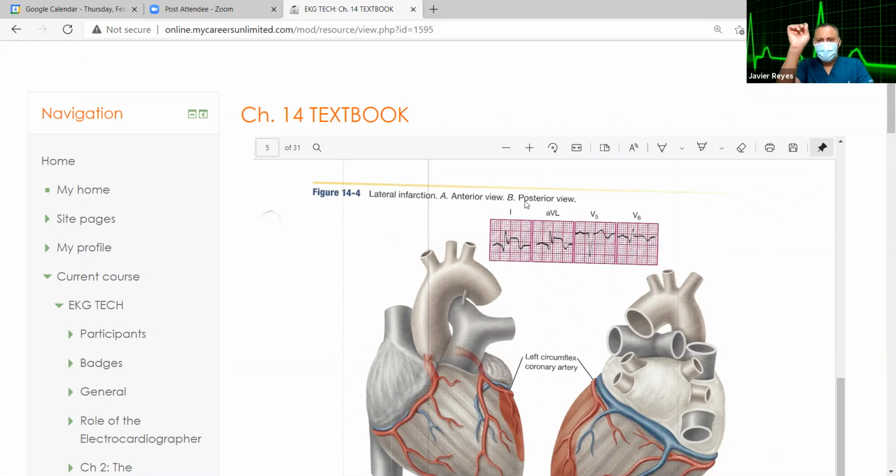You see the little Q going down, right? And then it goes back up, and you can actually see an R, right? It came back a little down, and then it goes right back up. And then it makes like a little flat line, and then it comes back down. So what do you call that segment? That piece? ST elevation. Because mine is kind of the same.